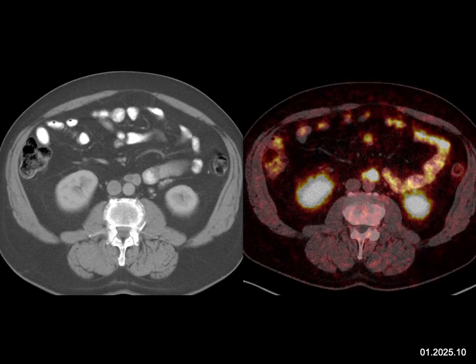They're positive on PET. Usually they're more vascular, but this case does not have a great vascular injection. It looks more like late venous, so that may explain why it doesn't look very vascular. Often it's larger, but it's a great location. And when you tell me the patient's hypertensive, I got to be thinking about an extra-adrenal pheo.